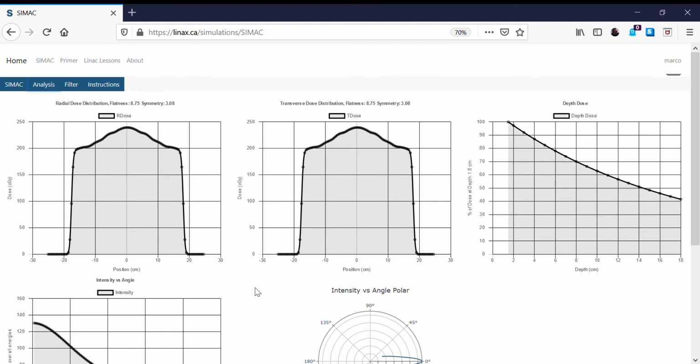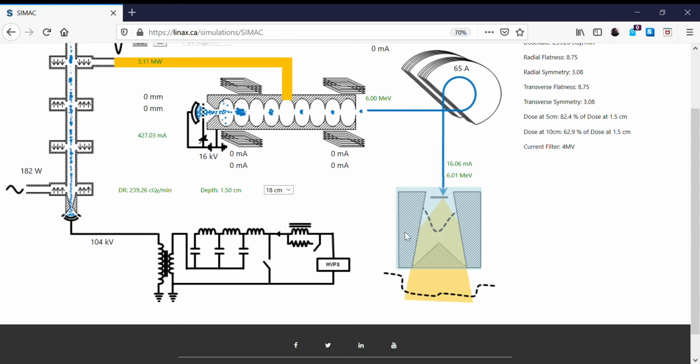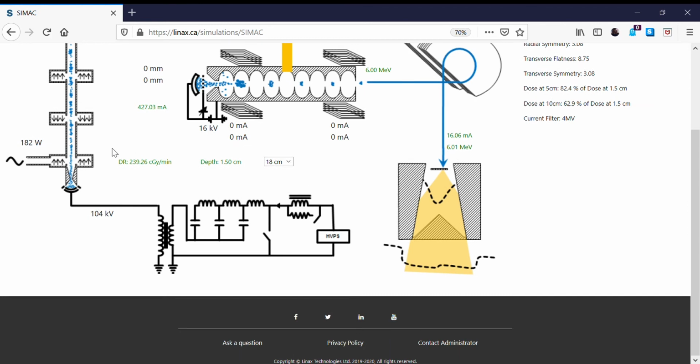I'm going to load in an 8 MV beam, and this is going to get exaggerated even more. So again, I have one pre-built. So now I'm going to go here and select this. I'm going to load in an 8 MV beam, and then we'll do the filter later. So for the 8 MV beam, I have the parameters defined for that.